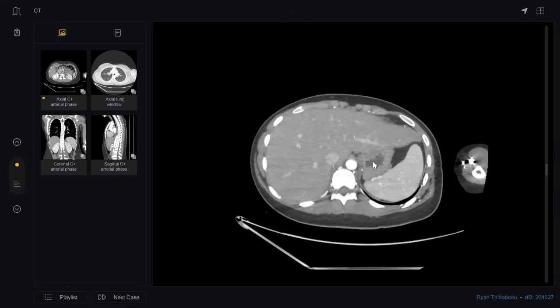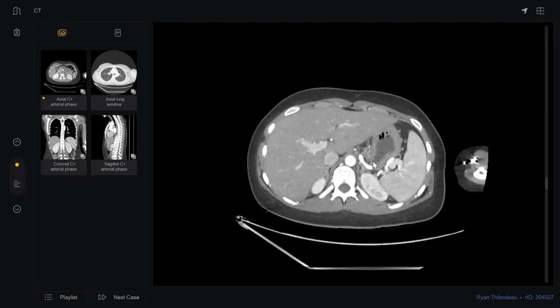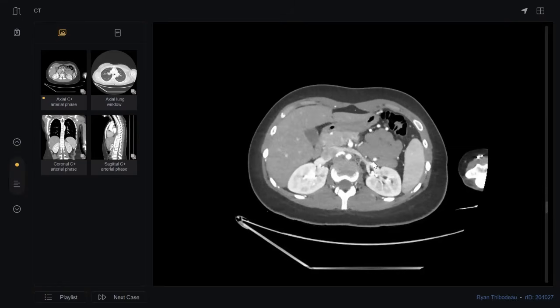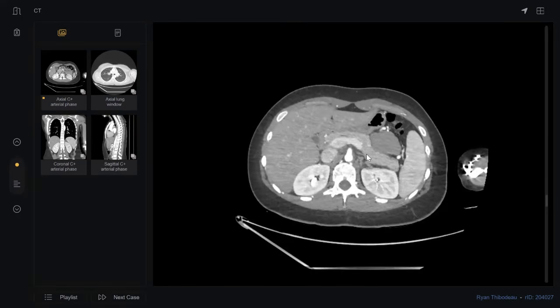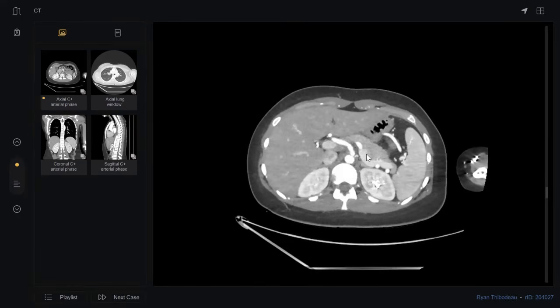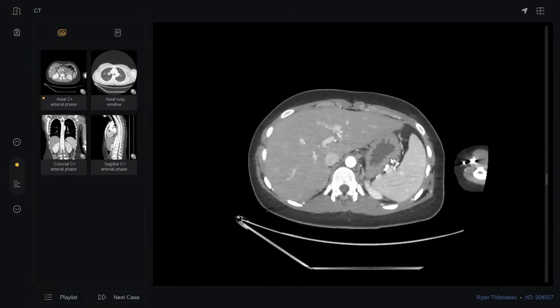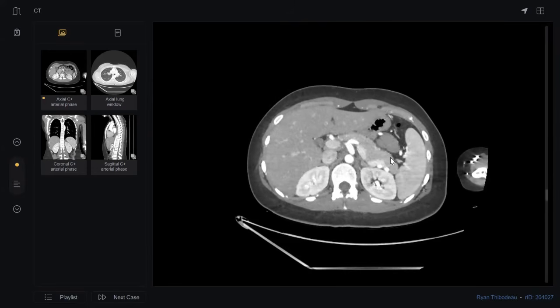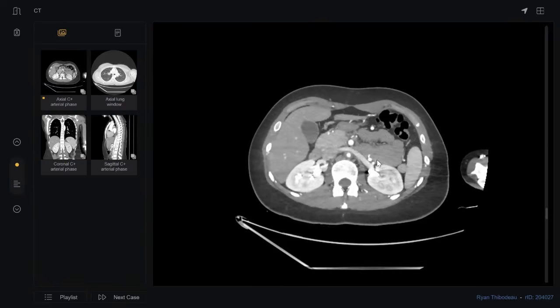It is an autoimmune vasculitis, and it involves the aorta and its branches as well. In my first scroll, I could also see some thickening along the origin of the left subclavian artery, so I think this might also be affecting the branches of the aorta.